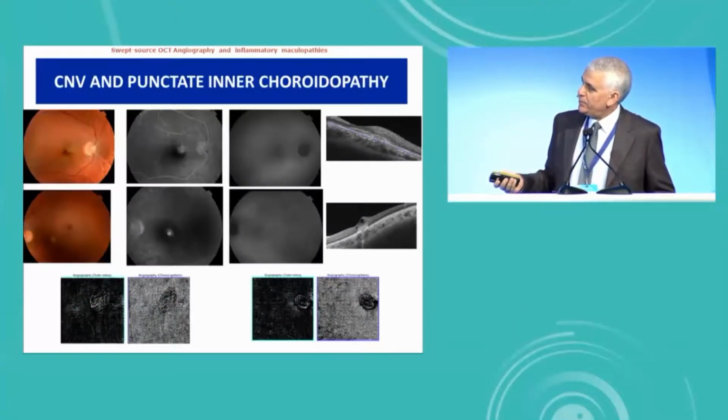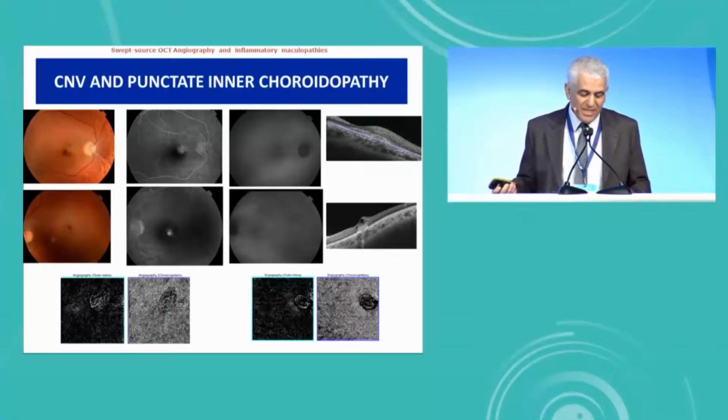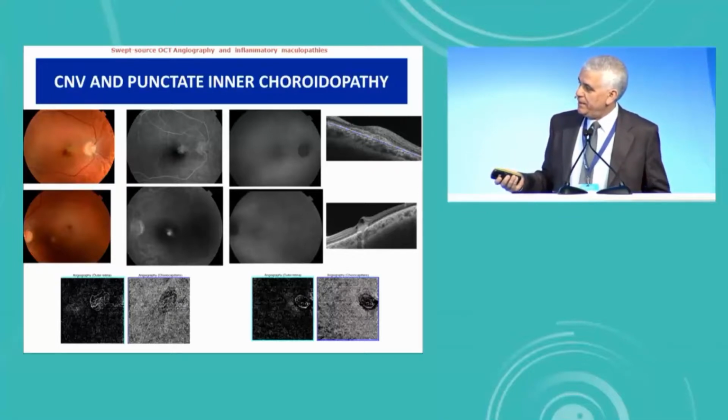This is a case of bilateral choroidal neovascularization associated with inflammatory choroidopathy, probably a PIC. And OCT angiography is very important in the diagnosis and in following patients and monitoring response to treatment.